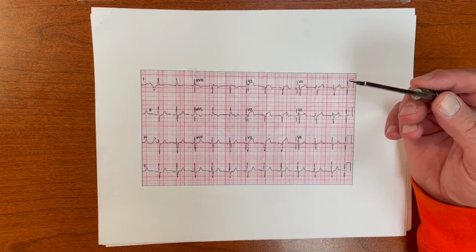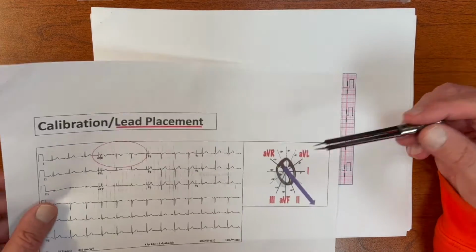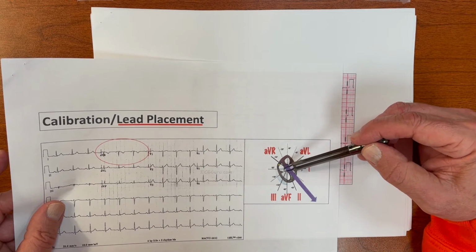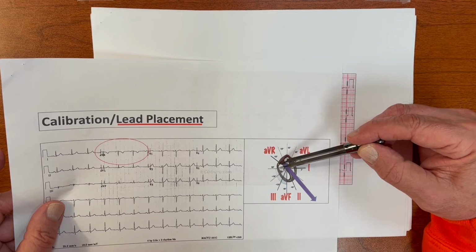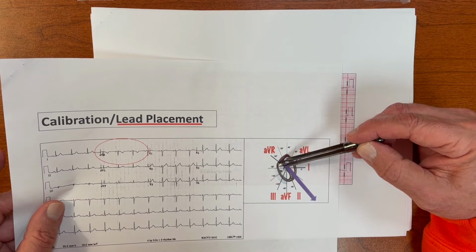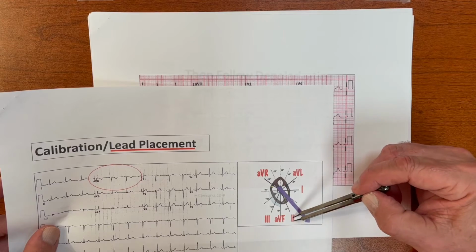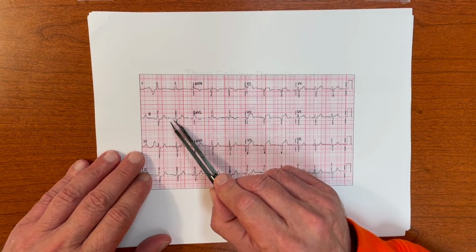Meaning, using principles that we know, if the P wave is up in AVR, then that P wave, the depolarization of the atria, is going towards AVR, so it must be going not from up to down, but from down to up. That would make it a positive P wave in AVR and a negative P wave in limb lead 2, and there we go, we see a negative P wave in limb lead 2.